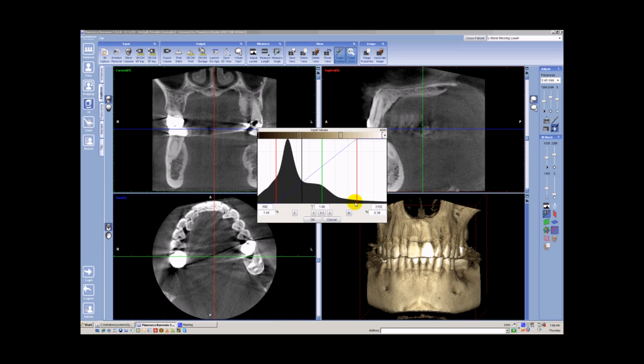As you move to the left, basically as I refer to coming up the ramp, you get into softer materials, starting with the hardest bone first, then into softer bone, then into tissue, eventually getting up to the edges of the volume area where the tissue edges end. And then once you get over the peak, there's other tissue values, and then eventually get into airspace values. Now here we have several different lines. We have the two red lines, which are basically nothing more than your gamma or contrast value, basically. You can adjust these appropriately to give yourself the view that you wish.